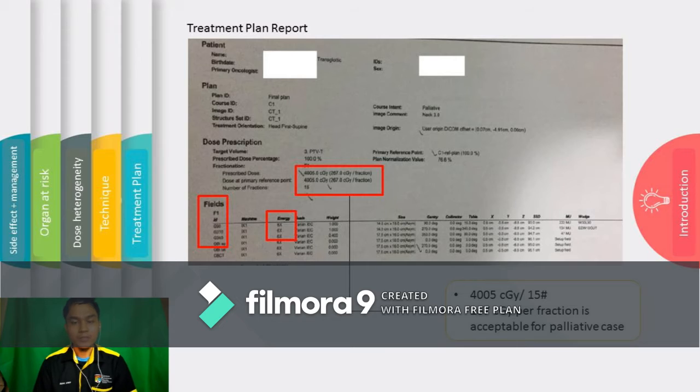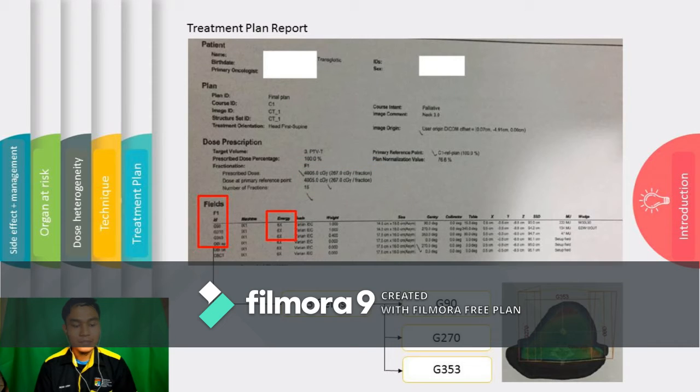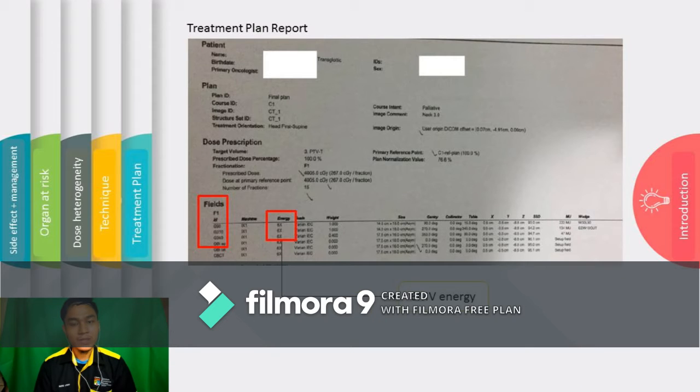We will go through the treatment plan for this case. Total dose is 40.05 Gy in 15 fractions, and because this is for a palliative case, 2.67 Gy per fraction is acceptable. There are three fields in this plan, which are left lateral neck G90, right lateral neck G270, and anterior neck G353. The energy used is 6 MV photon.